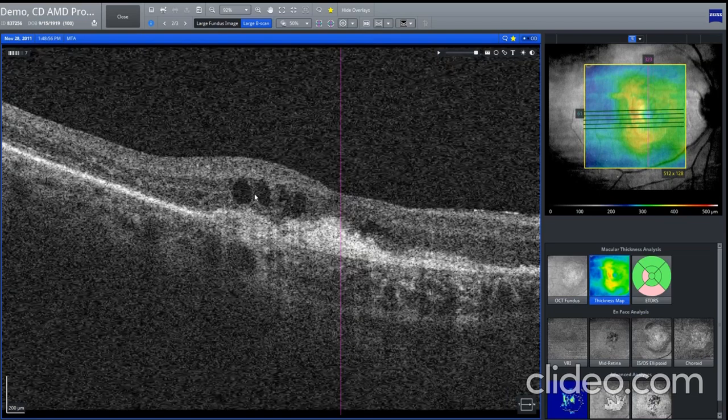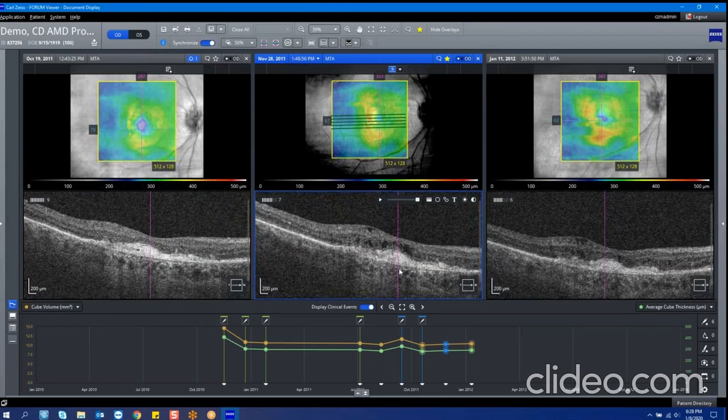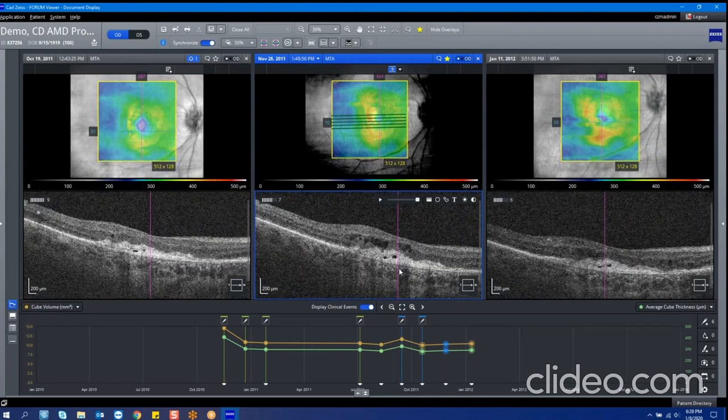That seems straightforward. Yeah, pretty straightforward. It is. The thing I find the most with this is it is pretty straightforward. Any changes that you make will save. You can easily delete them, so nothing is permanent. You're not going to come in here and do something that's stuck. But we find that there's just a lot of features, so it takes getting in there and using it for you to feel comfortable with it. It can be a little bit overwhelming at first, but pretty straightforward and user friendly. Need to spend some time with it now after this discussion.